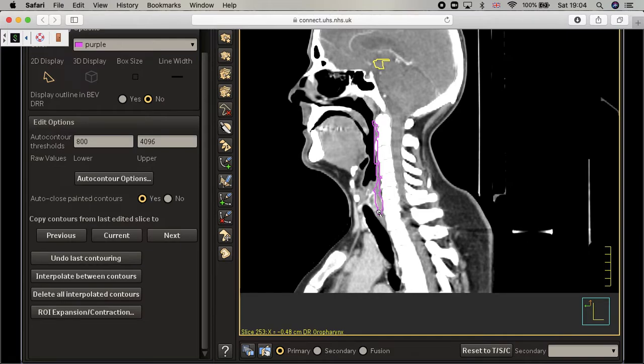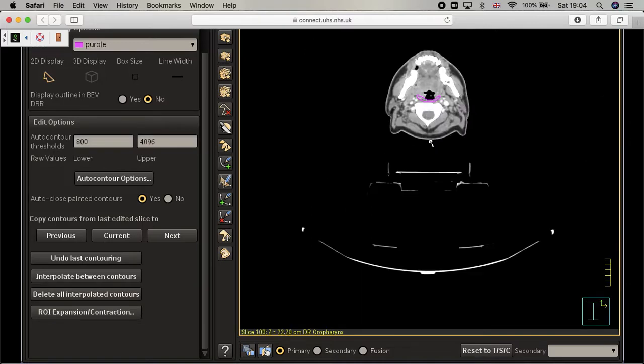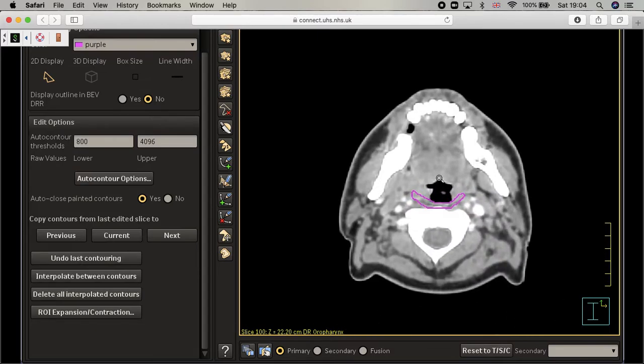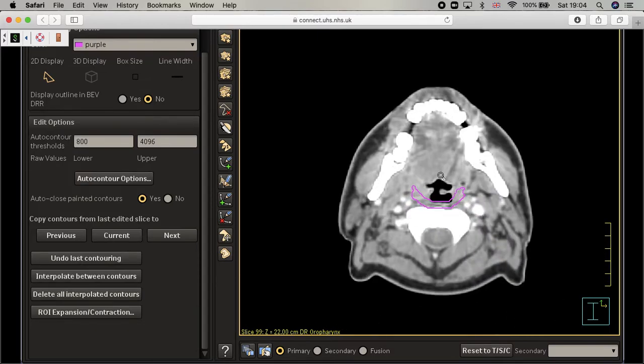From the cricoid down to the esophagus, you can call it the cricopharyngeal muscle. If you are not happy, you just do it as one piece, and this is what the S2 guidelines in head and neck cancer would tell us to do, so you don't have to worry about it. But I would start to familiarize myself with the pharyngeal muscles nowadays, because it's coming very, very soon that we may need to do it after the DARS trial. I think it's too much for you today.